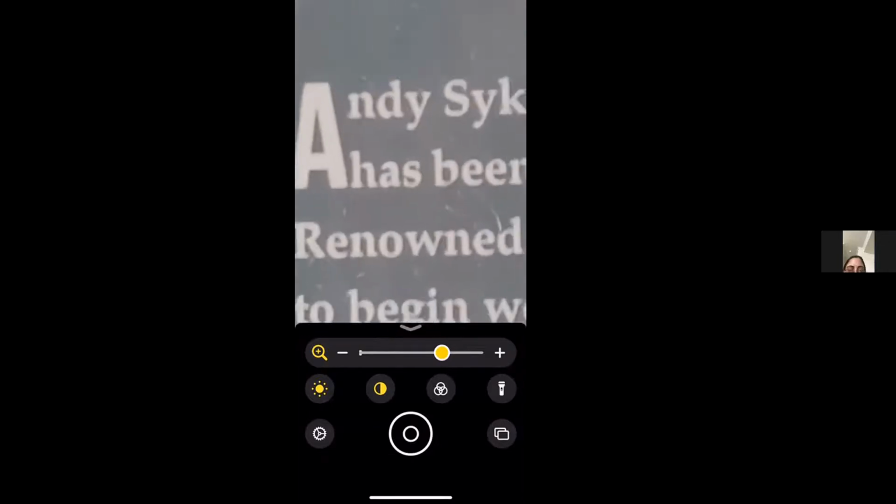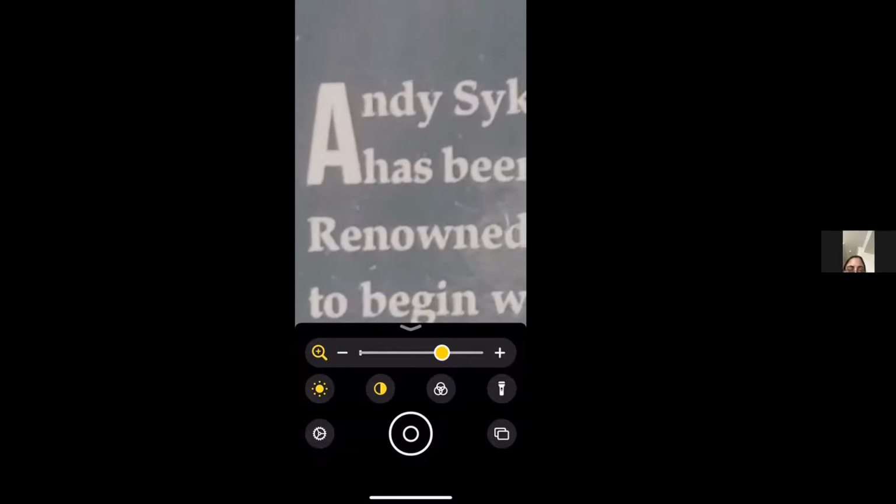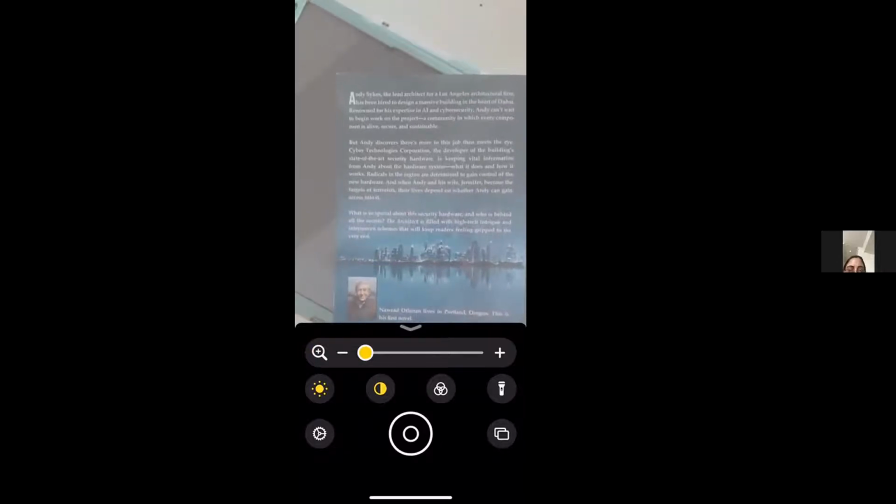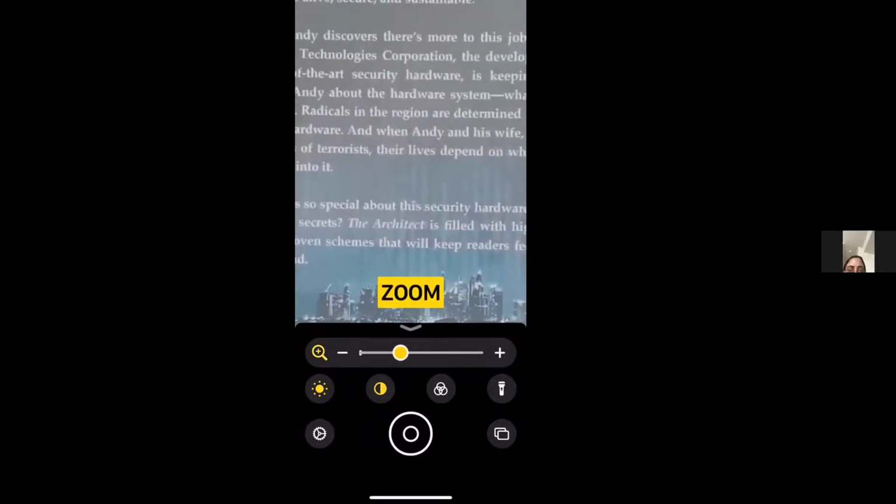It's the back of the book. I would just show you how big it can go, and I'll make it smaller. So this is the actual size. And we can just use it as much as we want until it's comfortable for us to see.